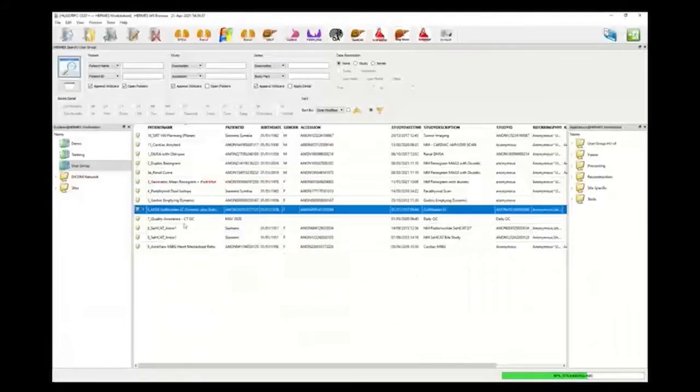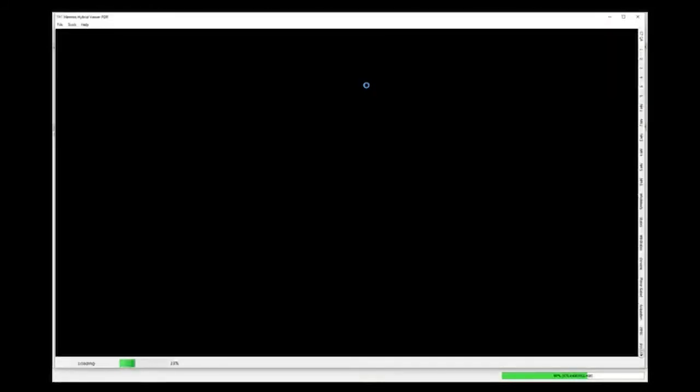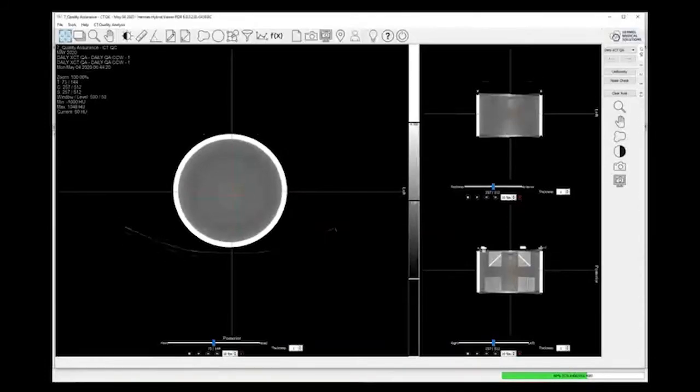Okay, so that's that. So on to a few new things to show you. I mentioned a NEMA quality control application for CT. That actually came in version 5.1 rather than version 6, but it's possibly something that some of you haven't seen. So I just thought I would show you it very quickly, just so that you're aware that it is available. I don't think this procedure is routinely used in the UK. I think this application has been developed mainly in response to requests from the States.